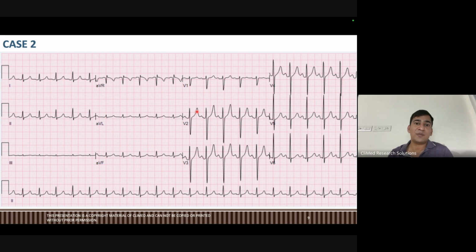This is how ECGs are printed, and this is how you read an ECG. QRS complex, T wave, P wave. I would be surprised if there is any other wave, or if one wave is absent. There is nothing rocket science that you cannot understand. It's very simple.